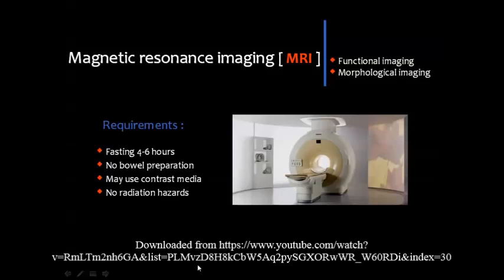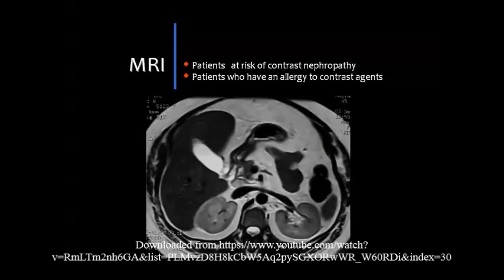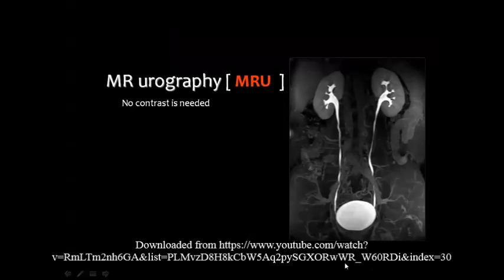And MRI is one of the important imaging techniques, but it is not usually used frequently in imaging of the urinary system unless we have the two main obstacles of contrast injection. If you are not able to inject the patient with contrast material because of the bad renal function or the marked hypersensitivity to contrast media, then you may revert to MR. MR does not require to inject the contrast material in order to obtain these images, which are very clear about the left kidney, the right kidney, the renal vein, IVC, and the aorta. And also you can obtain this image without injecting the patient with contrast material.